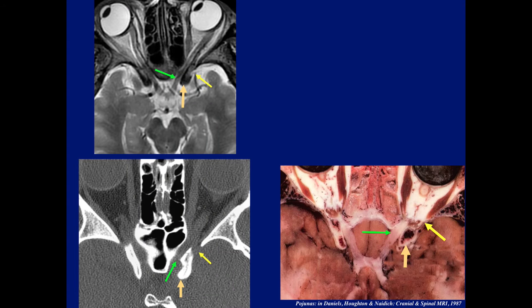Okay, here we have a lesion. What is this lesion? Somebody mentioned meningioma, not a bad possibility. Anything else? Yes? Asif mentioned schwannoma. That's a good call. I want to again remind you of the anatomy here.